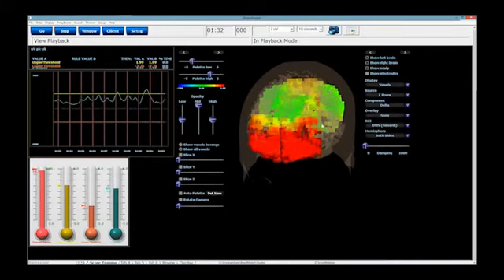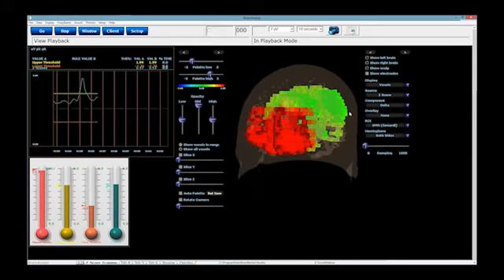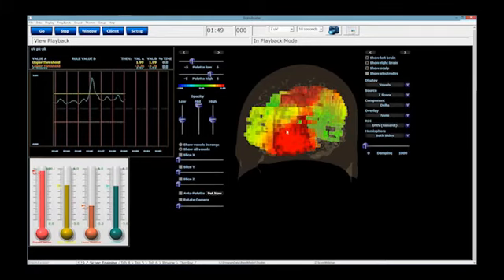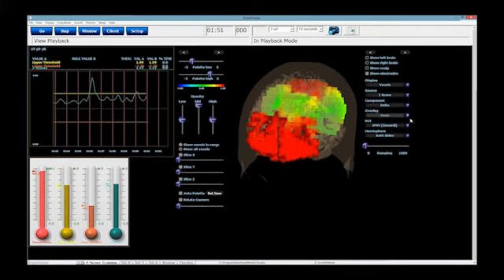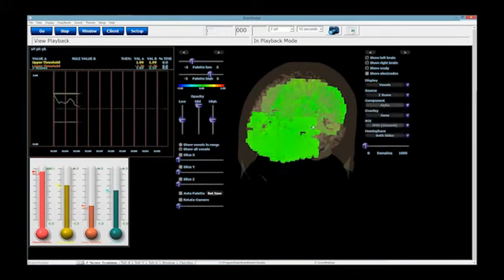You want to basically make sure you're always training what you're training and you know what you're training. So if you're basically using this more as a graphic to let them look at something and you're just doing the training over here, Select ROI and Select Band aren't good for you. But if you're going to utilize it to know this is what you're training today, please focus on this, please make the green jello, then this is going to be very powerful for that. All right, so those are new features.